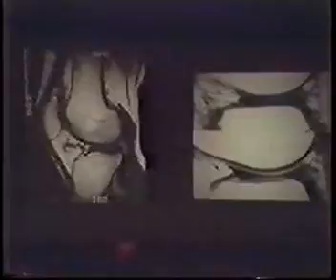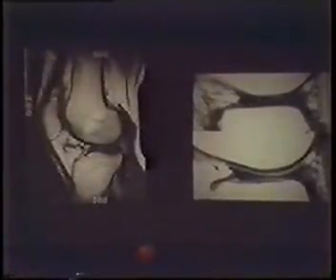But to evaluate the intensity of the signal and the morphology, I think it's very important that you standardize, have rigid standards for the way in which the meniscal windowing is done. If you have a meniscus that has signal within it, if you vary the window widths and the levels, you can make that signal change its configuration.